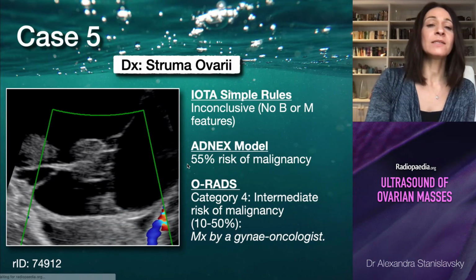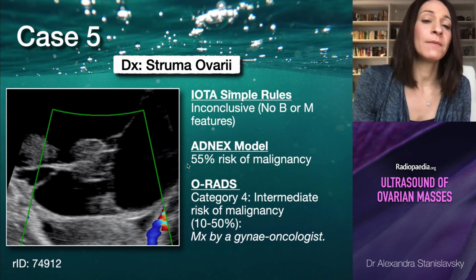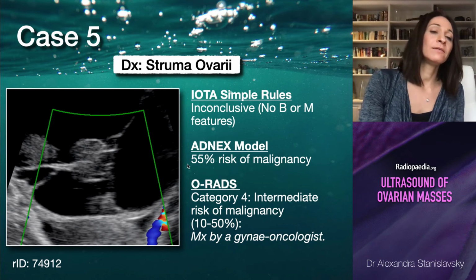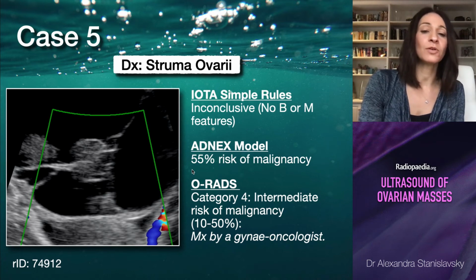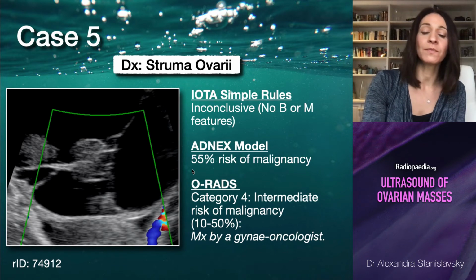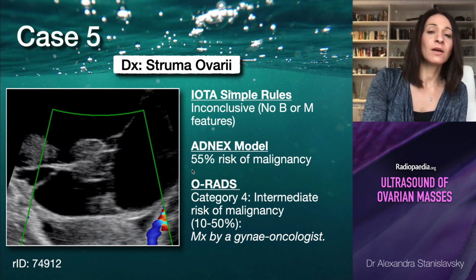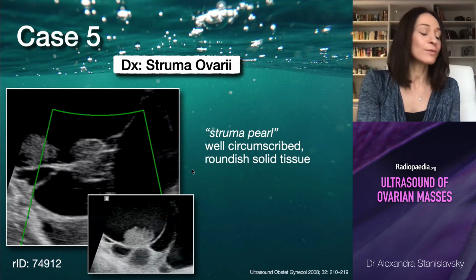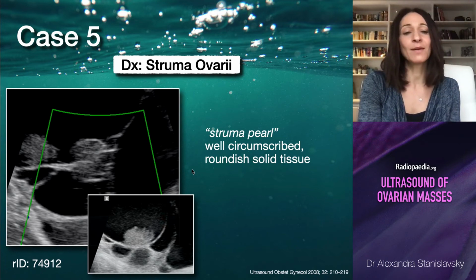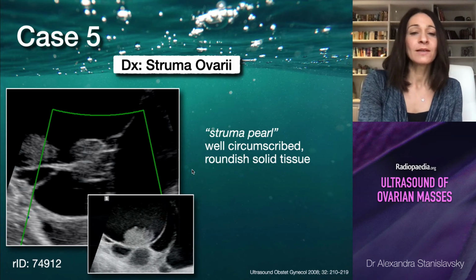And so this is a struma ovarii, which is a fairly rare subtype of the teratoma tumours, which has got a large, predominant component of thyroid tissue. Just as a little bit of a side point, or perhaps for geek points or for path exam, really just out of interest.